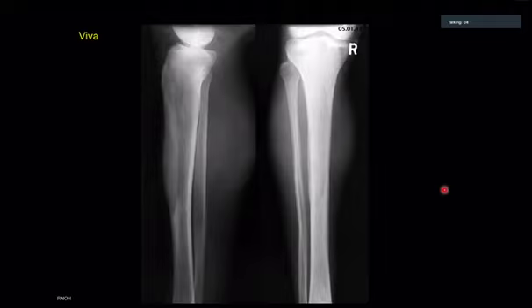Inferiorly, this area narrows to a point, and thereafter the diaphysis more distally looks normal. There is perhaps some early trabecular thickening at the more proximal aspect, just distal to the tibial plateau. The appearances are in keeping with lytic, i.e. early phase, Paget's disease.